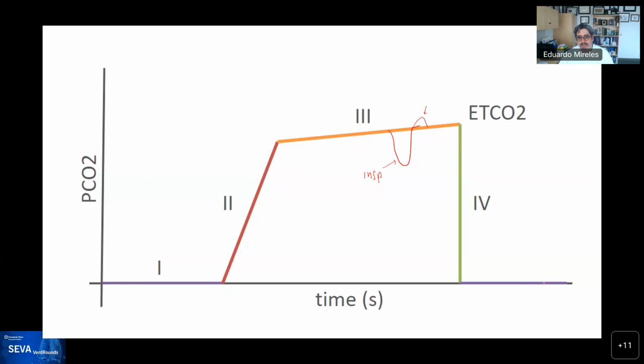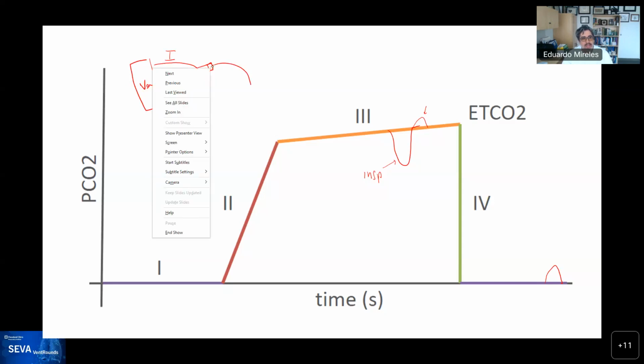The same during inspiration, you may see bumps that tell you the patient is actually trying to exhale through the circuit, and you see those humps and bumps in your sensor, which usually sits at the Y. For those of you having issues with what the Y is, it is essentially where the inspiratory circuit coming from the ventilator and the expiratory circuit meet. So here's the ventilator, and here's the connector to the ET tube, and then this goes to the human, and the sensor would be around here, capturing the signal to give you this CO2 tracing. Rob, thoughts?